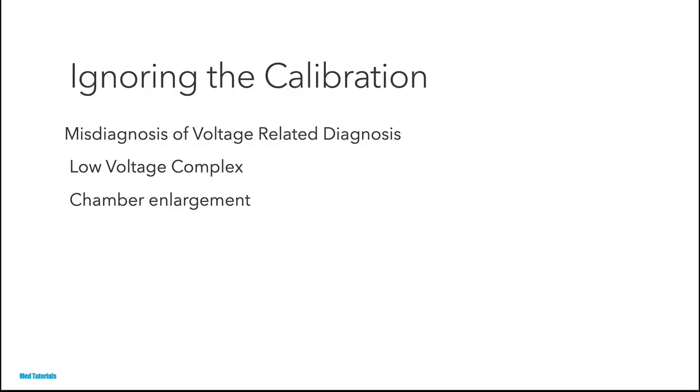So if you ignore the calibration, you're going to have a misdiagnosis of voltage related diagnosis. Like for example, you could underdiagnose or you could overdiagnose a low voltage complex or even chamber enlargement if you ignore the calibration.